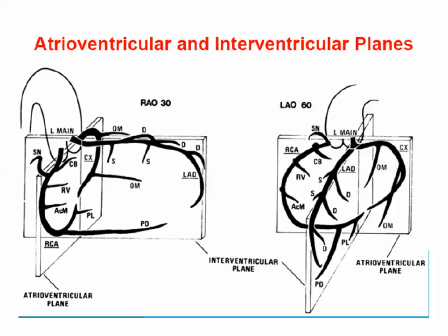This slide, you will find in any coronary angiographic lecture. Okay? This illustrates what I said before. What's this? The two planes. This circle will be what? Atrioventricular. And this is interventricular. This is the atria. What is this view? It is RAO. Okay? So here the LV, here the LA, here the atrioventricular sulcus, and here the interventricular sulcus.